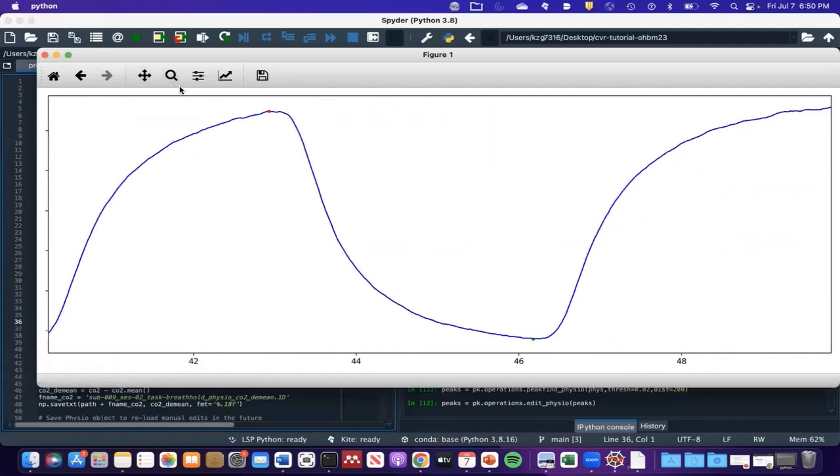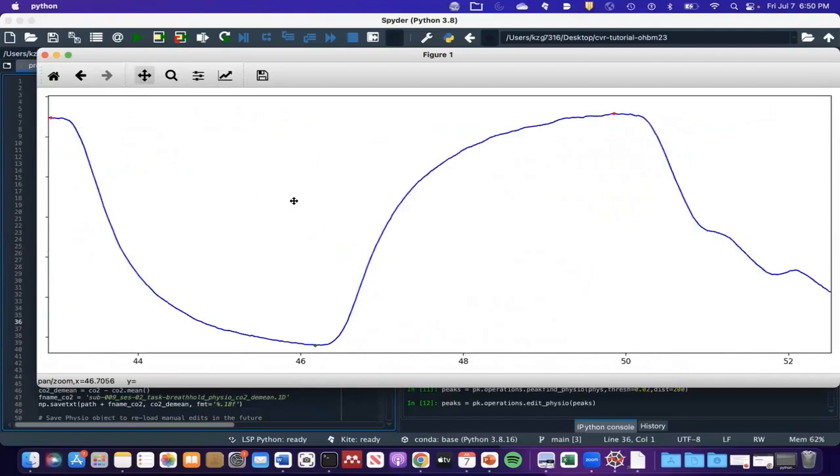So I removed that one as well. And now this is the peak after the breath hold, and it looks fabulous. It was higher than the values before and looks like that plateau shape. So I'm going to keep scrolling through here.